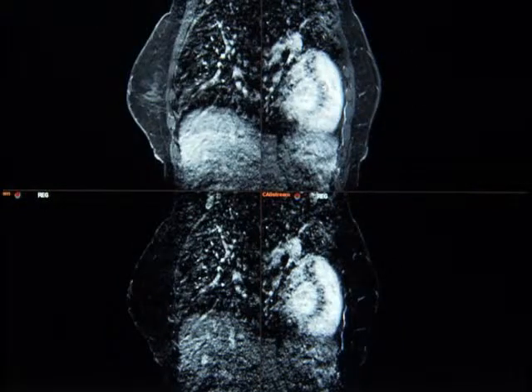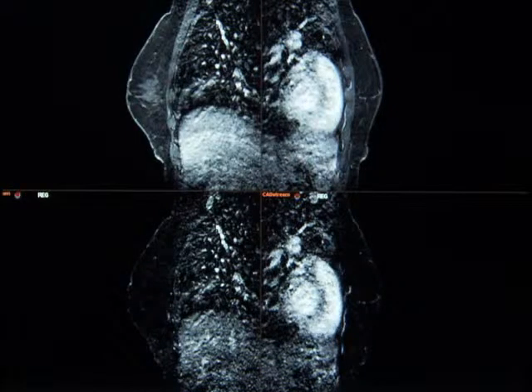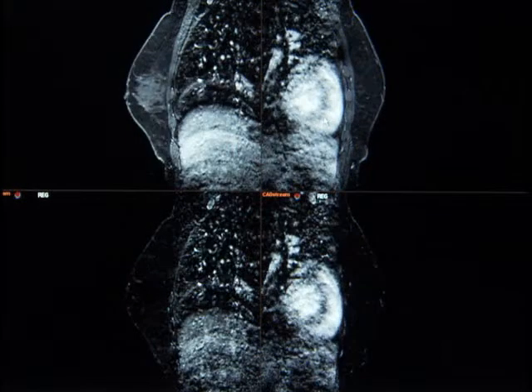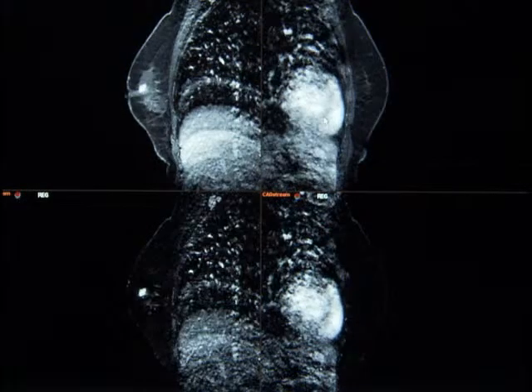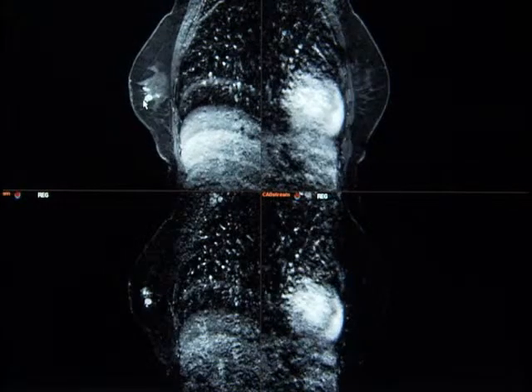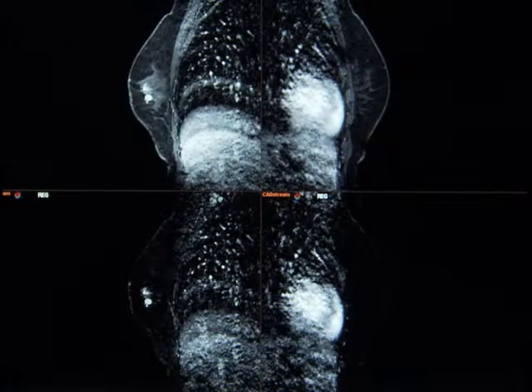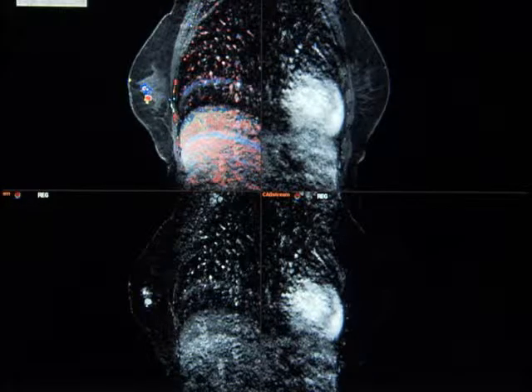On the left-hand screen, we have demonstrated our raw data with our 1-minute post-gadolinium fat-saturated pulse sequences imaged right and left superiorly, and linked with that are the 1-minute subtraction images. This is where you go through and do your detailed analysis, slice by slice, of the data, evaluating morphology of the enhancing lesions, again evaluating enhancement kinetics of the lesions.